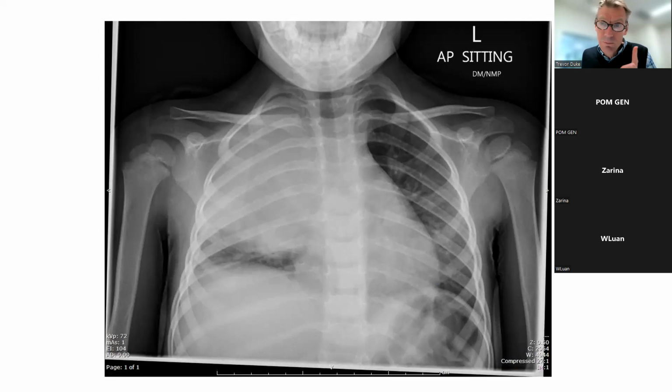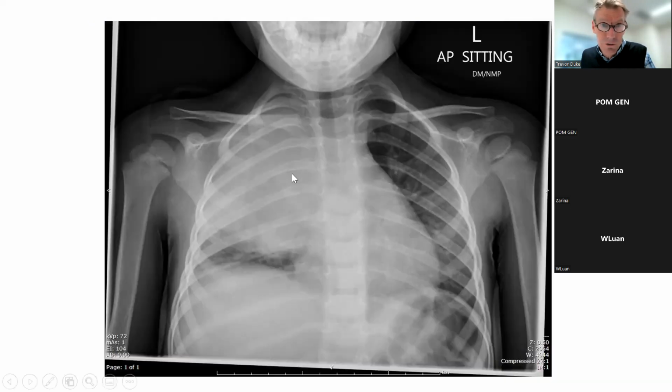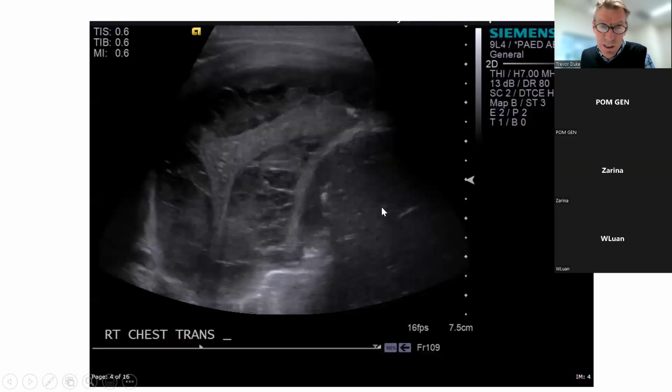I want to show you a particular ultrasound of a chest so that you can get a good idea. So this was in fact this child, right? So this child, it wasn't very clear whether this was fluid or whether it was a mass. And so an ultrasound of the chest is this child's ultrasound. And I want to go through it. What's this structure here? Liver. The liver, good, very good, Ernestine, that's very good. That's the liver. And so this structure here above it, the band above it, what's that?